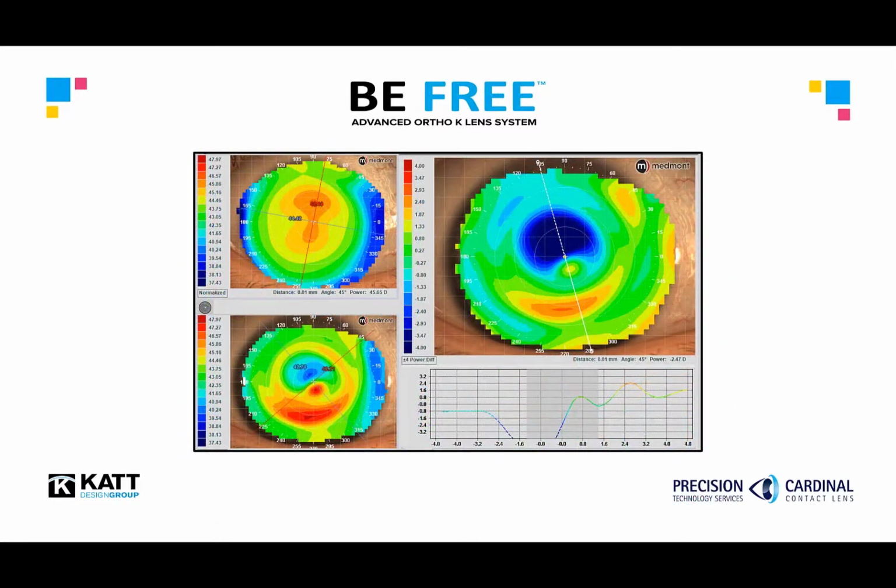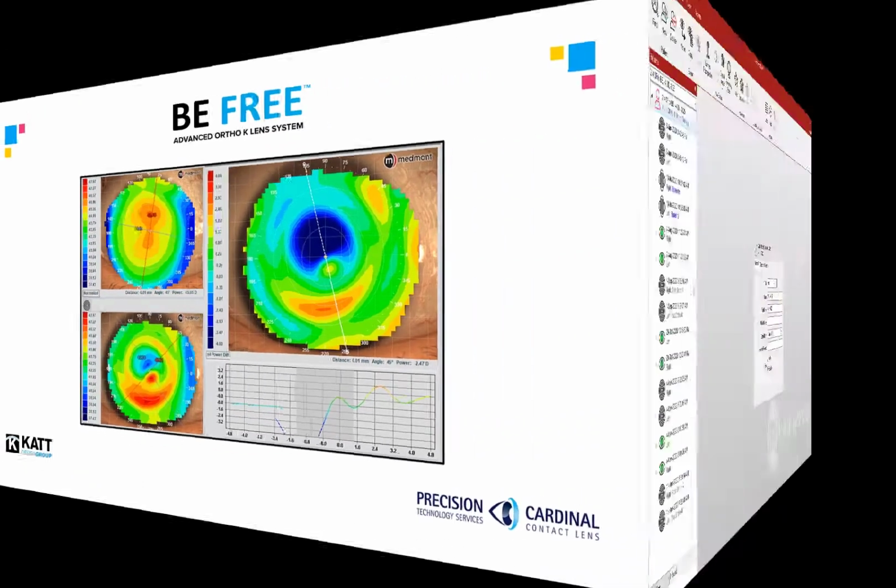In our second case, we see an effect that appears to be displaced high on this cornea. This usually results in acceptable AM vision, but a swift drop in effect towards the end of the day. Or the patient simply has poor vision from morning to night. Modification to the lens specifications could significantly improve the outcome. Let's review how the Be-Free software makes these complex parameter changes easy, with only a few clicks of the mouse.